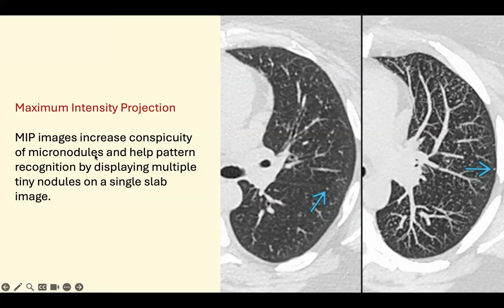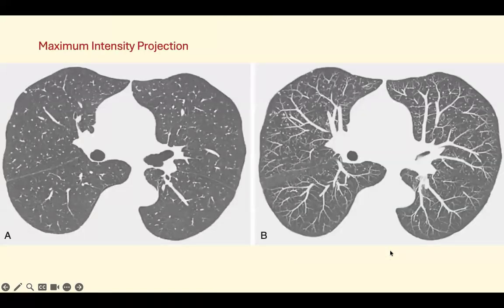This will enhance visualization of the vessels. And plus visualization of the vessels, it will enhance visualization of the tiny nodules. As you can see here, you are worried or suspecting, are there true nodules or not? See, using the maximum intensity projection, they are obvious and they are miliary, randomly distributed.